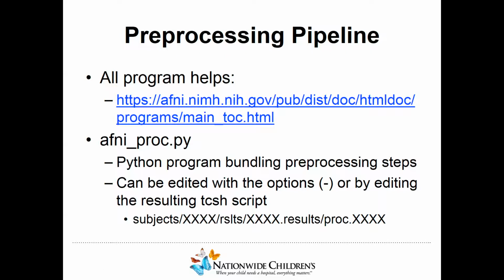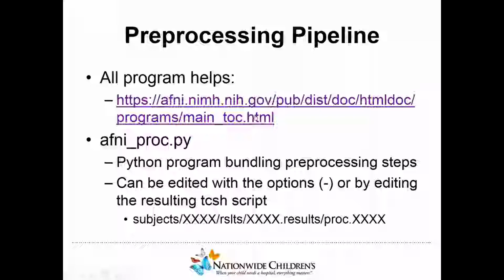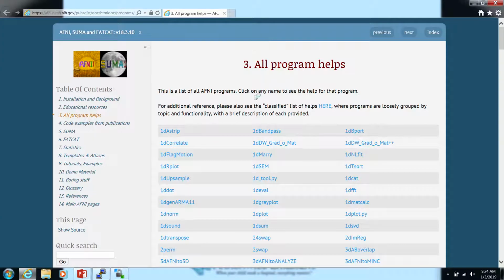So within this website, if we look at this, this is the AFNI website, afni.nimh.nih.gov. And this is their program help page, which you can always access from the main site.